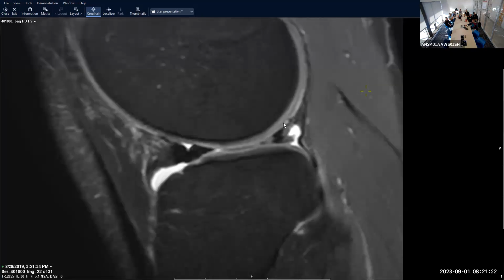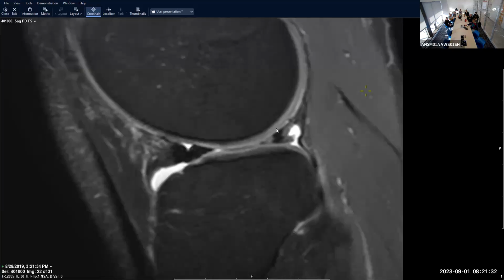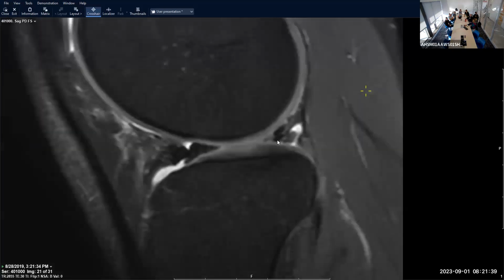But as we continue, we see that the posterior horn, this is kind of called ghosting of the inner free margin. You can have ghosting of the whole posterior horn or just part of it. So we have some relatively normal-ish tissue back here, but this area is not low signal intensity, it's of intermediate signal intensity. Okay, so that is one indication, and it's a relatively tiny posterior horn if you compare it to this normal anterior horn.